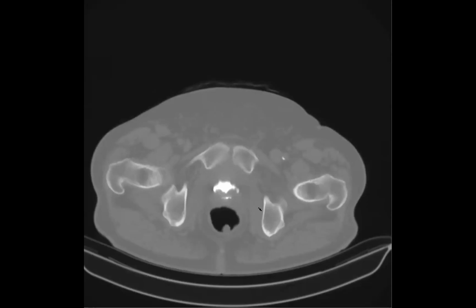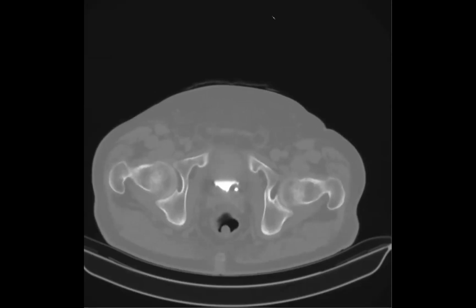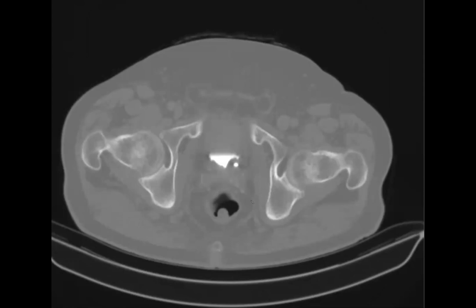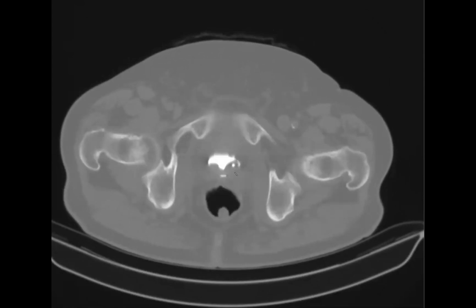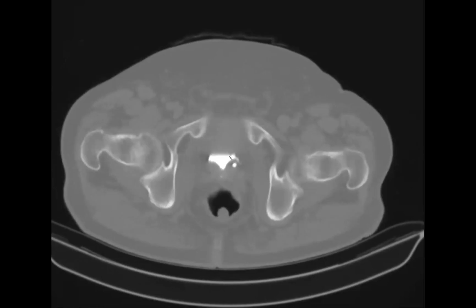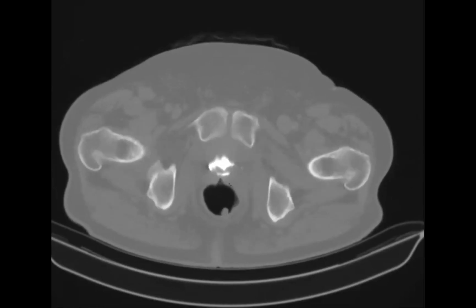And then this is my last case. This patient had a prostatectomy. We've shown a couple of cases here where after prostatectomy, there's a little leak. So this patient, we did a urogram, and you could see contrast in the bladder, and also a tiny little leak posteriorly. This was an outside scan. We didn't go further down than this.